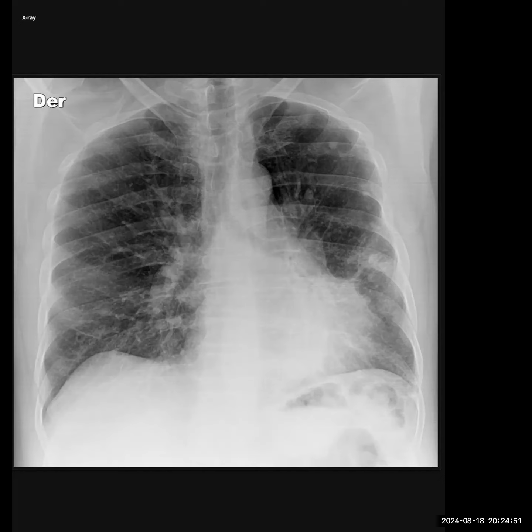Okay, I think I do see a retrocardiac opacity. In the light of these new findings, does your diagnosis remain the same or would you make a change? No, my diagnosis would change. Since I can see a retrocardiac opacity and diffuse reticular shadows with nodular patterns, now I'm thinking in terms of a bronchogenic carcinoma with probably a lymphangitic picture.